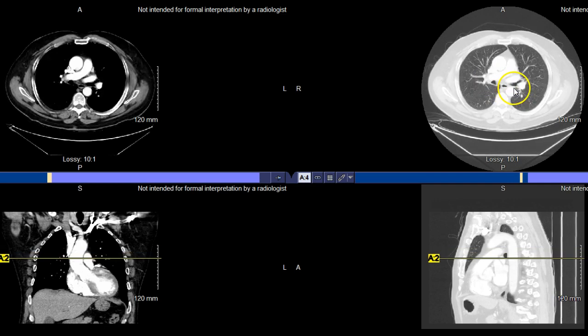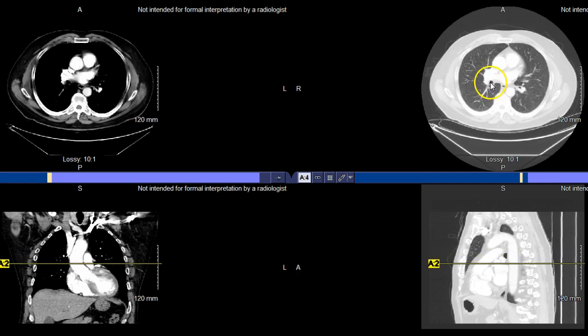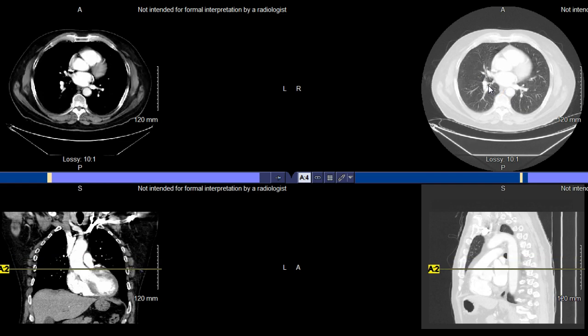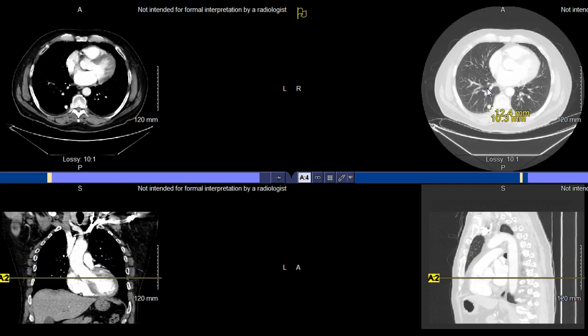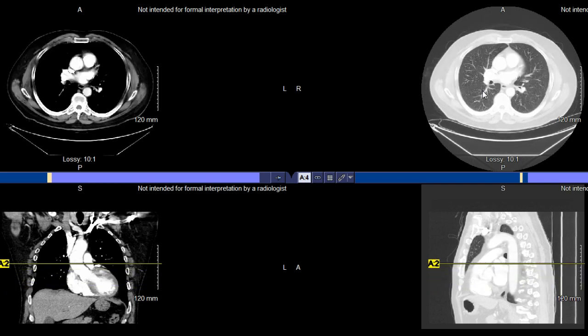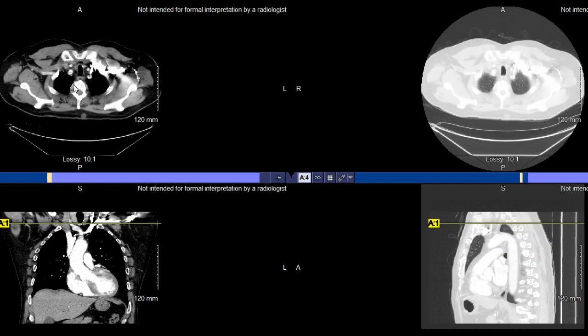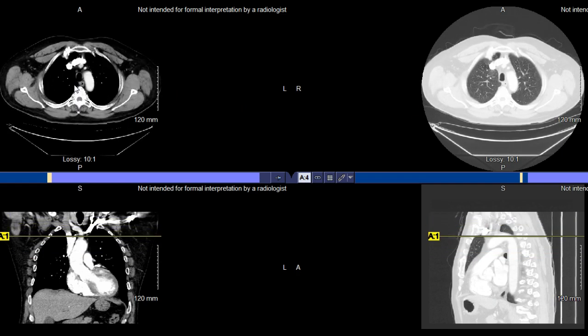And you can see how it's going out. It's dividing there respectively. And you can see those additional divisions then that are going to take place as it feeds essentially each of the individual lobes. So really, I think a pretty good data set to look at some of those basic anatomical structures there as we see kind of those bifurcation points, those divisions.